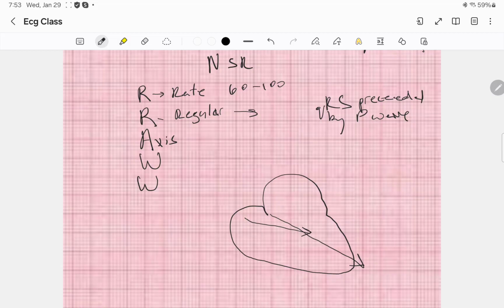So both the ventricles and the atria in combination have a similar mean electrical axis. Now, what does this mean? Do you need to go about calculating the actual degrees of the axis of the P wave?